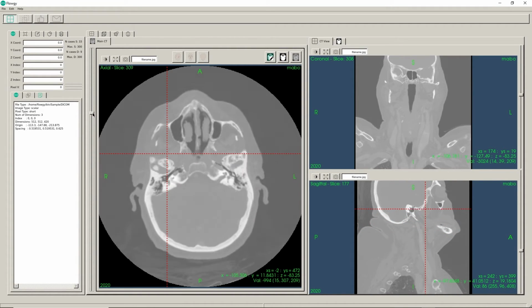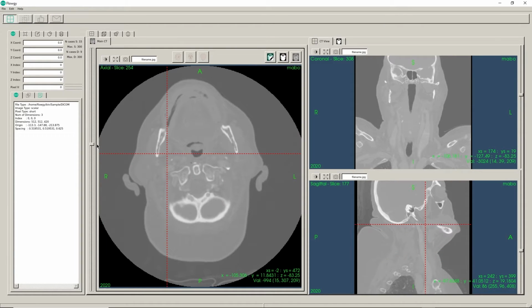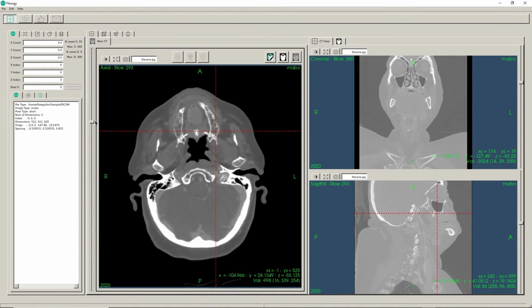The slider on the left side gives us the option to view the CT scan as a flowing image. If our CT scan, or a single image for example, does not have a good contrast, which means we are not able to identify bone structures or sinews, we have the option of changing the contrast. This is done by double-clicking and holding the left mouse button, and then drawing into the direction until the result is satisfying to us. The contrast change is going to be applied to all of the pictures.